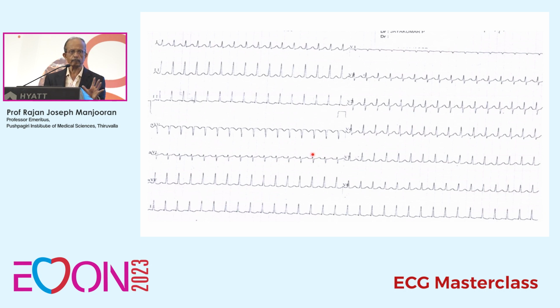Now there is a quiz program. If you don't answer, I think we will stop at that level. So I am going to show you arrhythmias. Anybody can try? What is this arrhythmia? Simple. This is very simple.